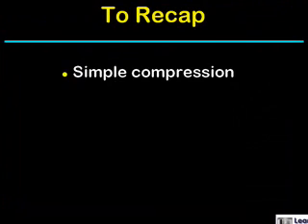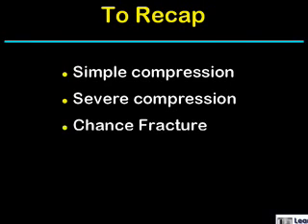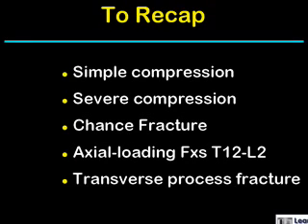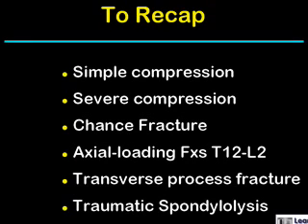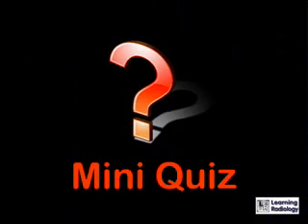To recap, we've looked at simple compression fractures, severe compression abnormalities, the chance fracture, axial loading fractures of T12 through L2, transverse process fractures, and traumatic spondylolysis. Here is your mini quiz.